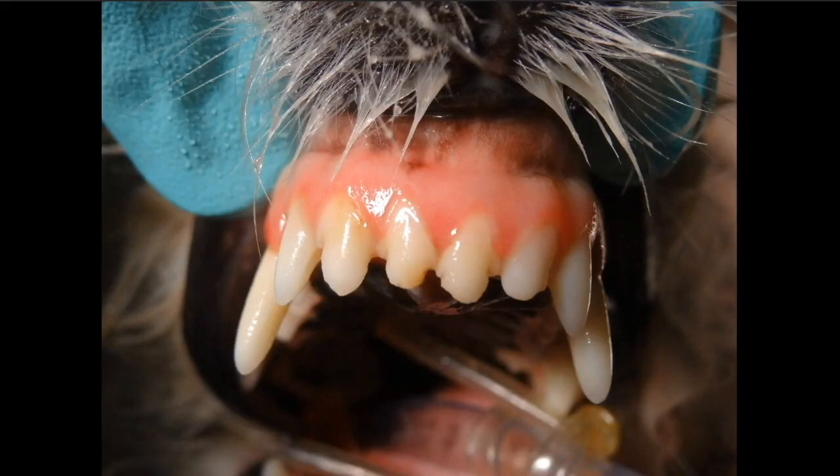So take a look at this image, see what you see. There are some changes there that you can note. They're not really obvious, but there are some changes there. So take a quick look at that, make a note of what you see. And if you look closely, you're going to see that there's some discoloration. Look at these three teeth versus the color of the other teeth, especially that second left maxillary incisor that's to the right of the arrow there. That one's pretty white. Those are kind of cream colored. So that's a good indication there might be some problems there.